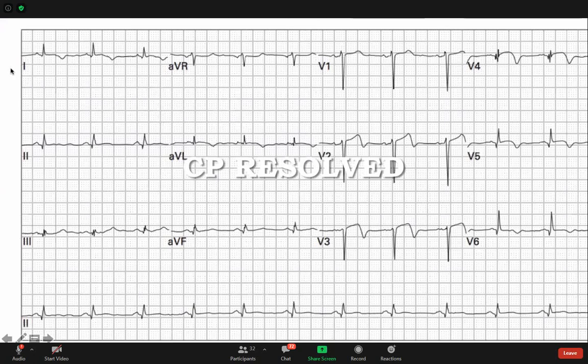السلام عليكم. طيب الحمد لله. Let's go systematic. So the same thing. The first question is every P followed by QRS? Okay.